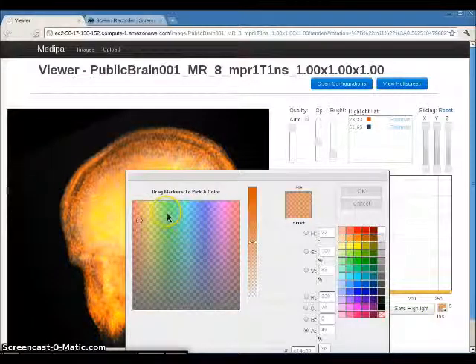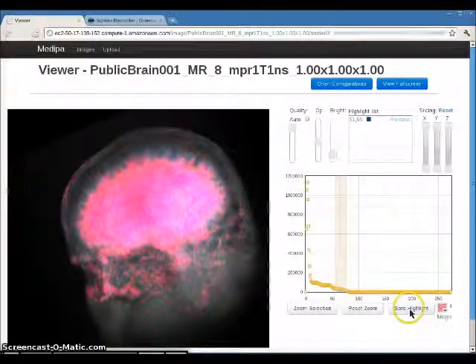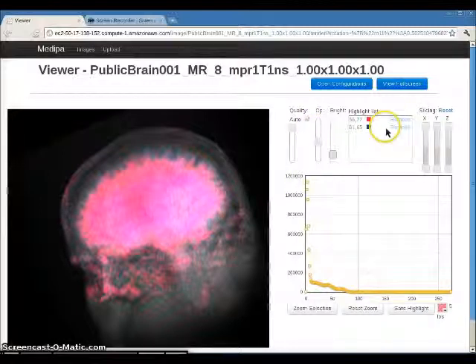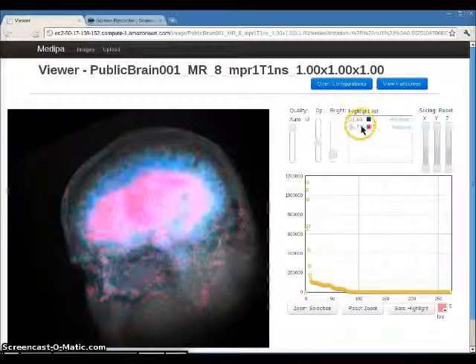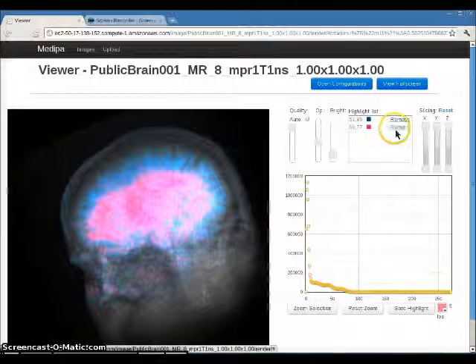and this time I'll pick, say, purple. And I'll get rid of the red just for now. And then I'll save that as a highlight. As you see, the purple seems to have overtaken the blue simply because it's overlapping the blue in a lot of places. We can sort the list manually, and now the parts that were overlapping with the purple have now been actually highlighted blue again. And as you saw before, I can remove a different highlight if I want.